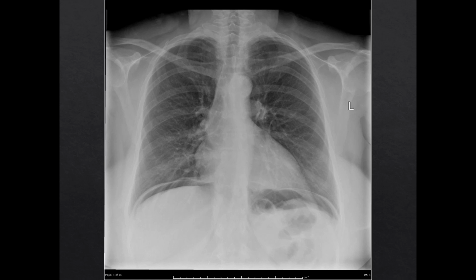This can be from things like peptic ulcers, cancer, blunt or penetrating trauma to the abdominal wall, or even to the lumen as well. It could be from necrotizing enterocolitis or even ruptured diverticulum. On an erect chest x-ray, you can see pneumoperitoneum as air trapped beneath the diaphragm. In this particular chest x-ray, the air is trapped on both sides, but that won't always be the case. Sometimes you'll just see it on one side or the other.